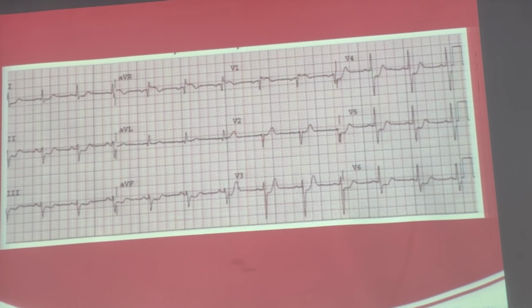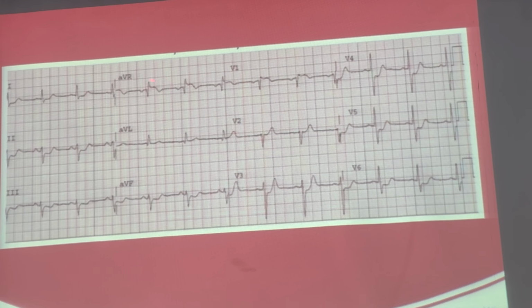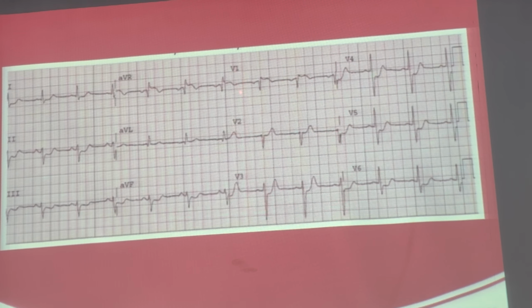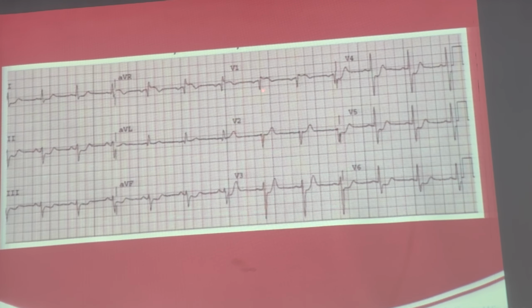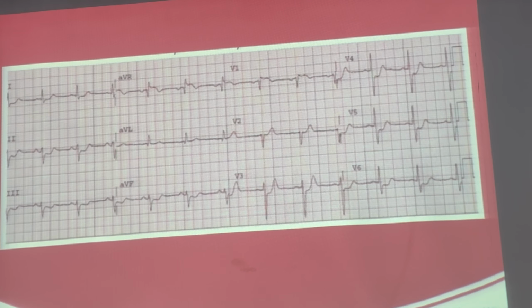So this is called a left main equivalent ECG because it does not always indicate that there's a left main obstruction. Sometimes some studies say if the V1 ST elevation is more than aVR, it's more towards the proximal LAD. But anyway, the management is the same, so it's an early PCI. Sometimes a patient with triple vessel disease can present with this kind of ECG.